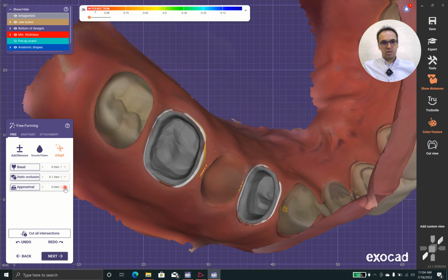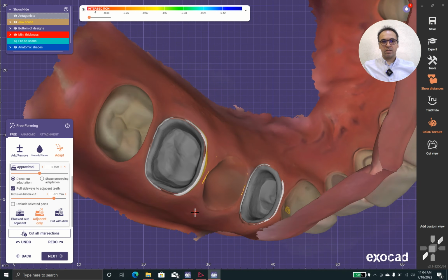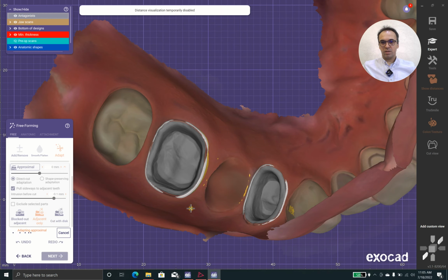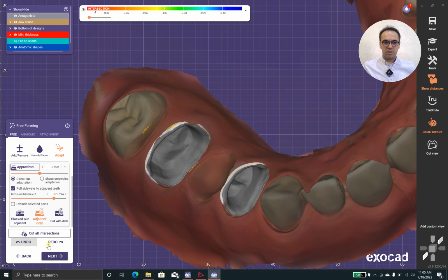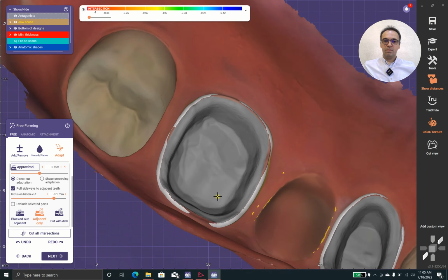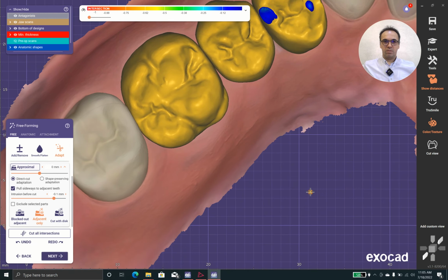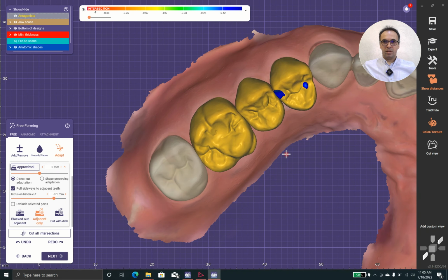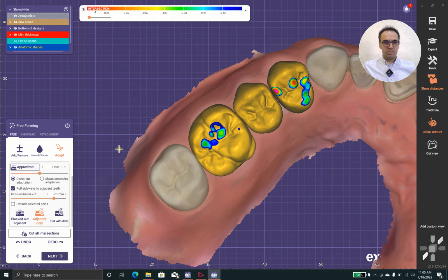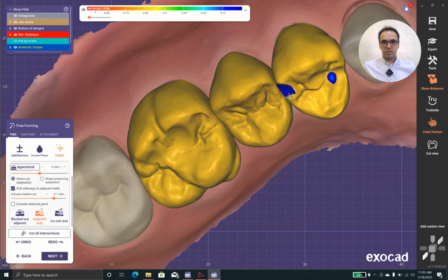Okay, but as I told you, I prefer to put the stick on and cut intersections. Look what's happened here. Look, this is the before, this is the after. This one and this one. And as you know, this difference makes a huge difference in the real world, because it makes the patient feel far better. Oh my gosh, we have something here. Okay, so I cut it again. Unfortunately, it cuts where it shouldn't be.